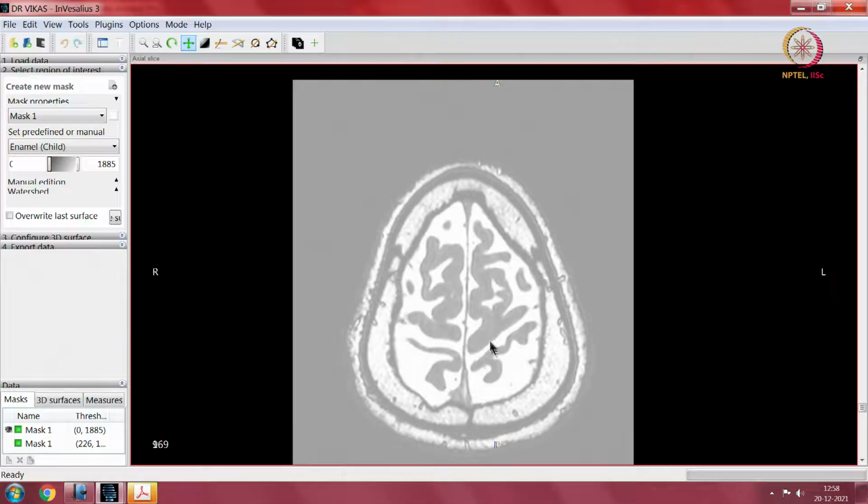You see very low organisms having a very distinct central sulcus with separation of this process. So, evolutionarily the brain thought of isolating the executing part, putting the executing part in front and the sensing part behind, and it has been continued like that. When we look at imaging, we find that the central sulcus starts in the midline and then goes all the way up to the periphery. That is the first landmark.